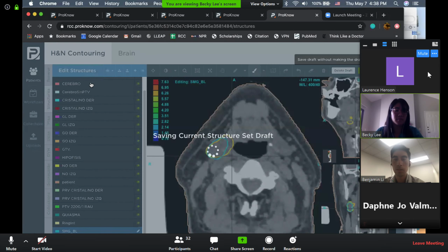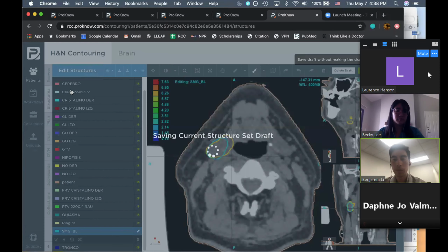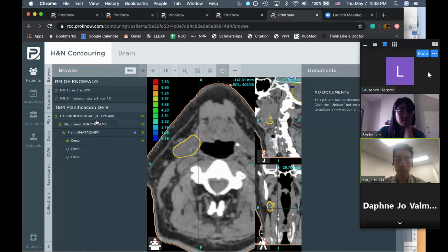Thank you. So just like a Word file or an Excel file, the plans that we work with in radiation oncology are saved as DICOM files. And DICOM is a kind of file that radiologists use for imaging. And since in radiation oncology, our plans are basically images, they're also considered DICOM files. And so here we see that there's a CT file.